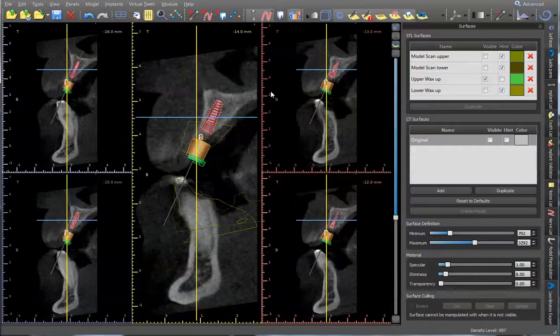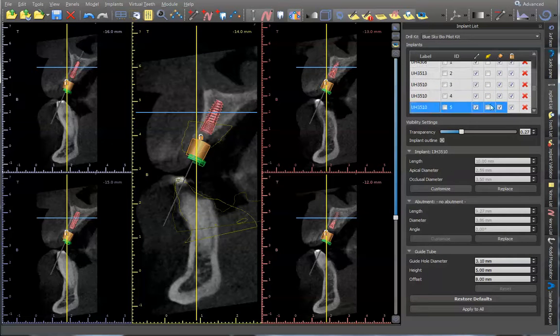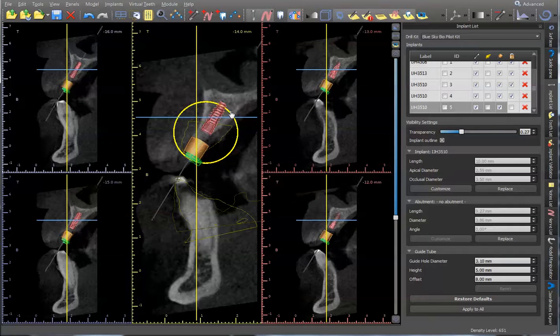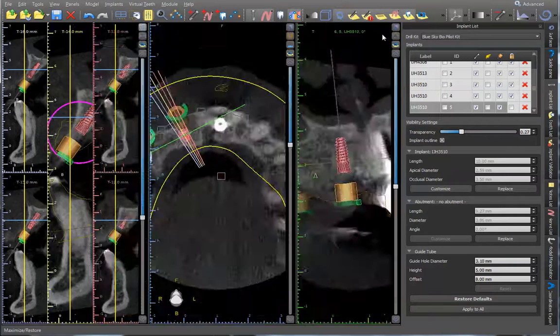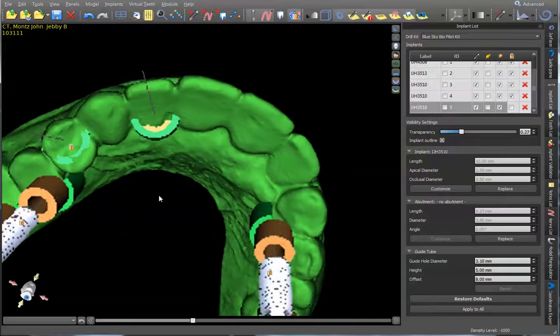See, now that's actually pretty good. Let's see, implant. And then that's it right here. I could just rotate it like that. That looks good. We'll look at it again. That looks a lot better. All right. So this will work out pretty fine.